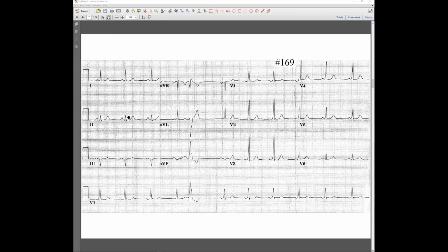Oops. Thank you very much. Odysseia, you heard that one? Yep. Okay. And especially if you do have P pulmonale, the initial phase of the P wave in V1 should be bigger than a terminal one, and it is not. Okay. Now let's see the next one.